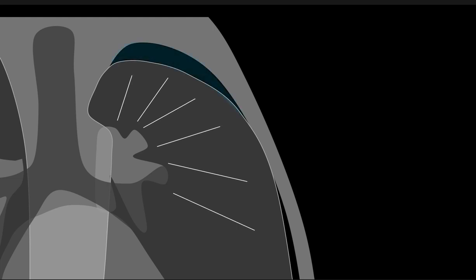All right. So another thing that you will read or hear is people talking about lung markings, specifically no lung markings in that area, the hyperlucent area, the area that you think is a pneumothorax. People say you shouldn't see any lung markings there. But what if you do? What if you see one or two lung markings through there? Does that mean it's not a pneumothorax?